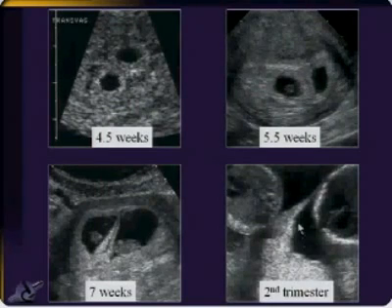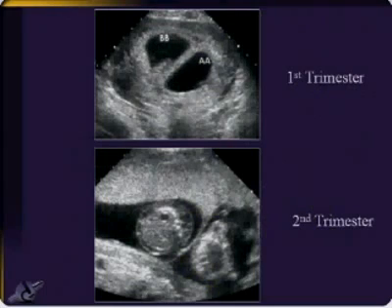Now we're in the 2nd trimester. Now the membrane out here is getting kind of thin, but we can see right here what we call the twin peak sign. Now somebody asked me, I don't get that sign. I mean, I only see 1 peak. Well, yeah, there's 1 peak, and there's 1 twin here and 1 twin here, and that's where the name came, the twin peak sign, the peak between the twins. So here we go, another one. Big, thick 1st trimester, twin peak or lambda sign here.